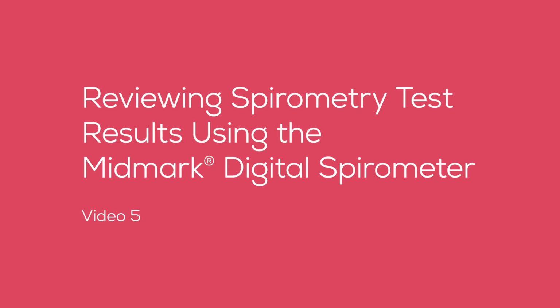This video is the fifth in a series of 6 videos created to provide an overview of the Midmark digital spirometer. This video will guide you through reviewing spirometry test results.